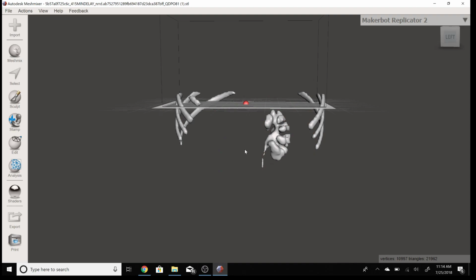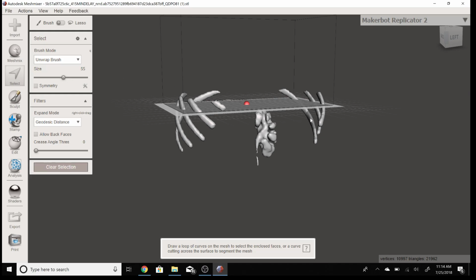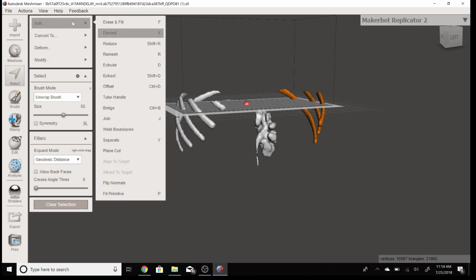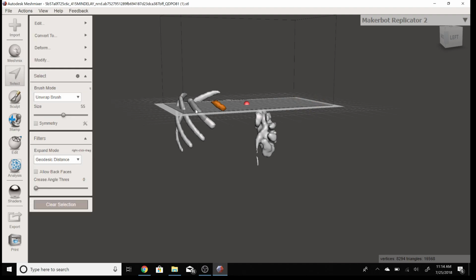So just discard that, and that's super easy. Now, if there was a bunch of organs in this, and they were all touching this calyx, that would be very difficult to do. That'd be very difficult to isolate it. But since there's contrast in the collecting system, you can just print it with just the bones, and it'll be nice and easy. And then we're just going to delete all these ribs, because we don't want them. So, yeah. Just delete all of the ribs.